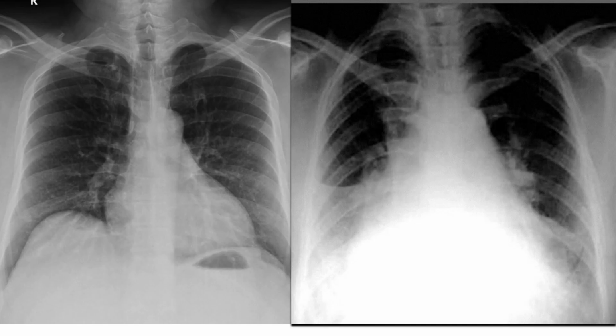Before going to the second and third questions, it's always good to have a normal X-ray chest PA view for faster learning and attention. So I'm giving a normal X-ray chest PA view, except that this X-ray chest has a few fibrotic strands in the apex of the right lung and is otherwise looking normal. Now we will assess the findings and the signs in our X-ray chest PA view.